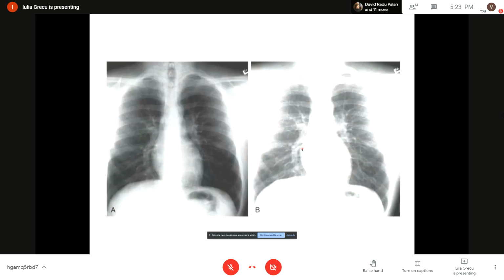On the other hand, this is an underexposed X-ray in which we basically cannot see any vertebral bodies. Like here, we only see a diffusely white shadow, and also we are unable to see what happens exactly in the peripheral regions of the lungs.